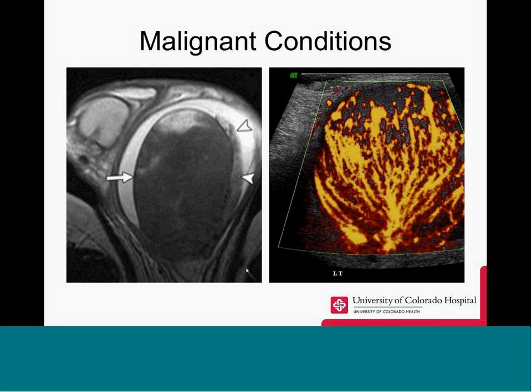Here on ultrasound, color Doppler imaging shows increased vascularity in testicular lymphoma. It may resemble inflammation in orchitis, but unlike inflammation, lymphoma is painless. Here we have an MRI image showing the lymphoma of the testis.